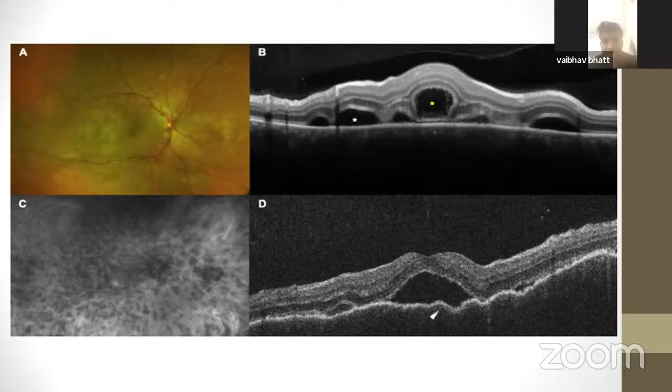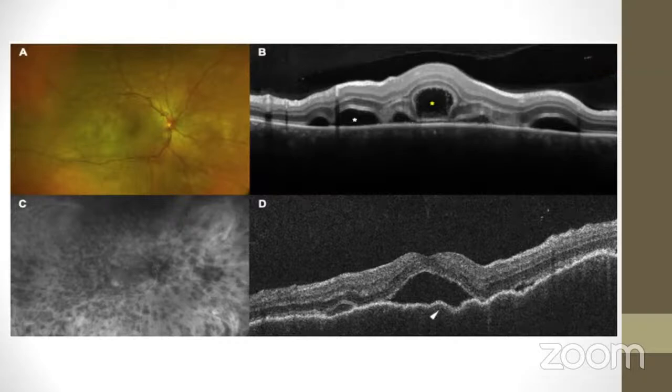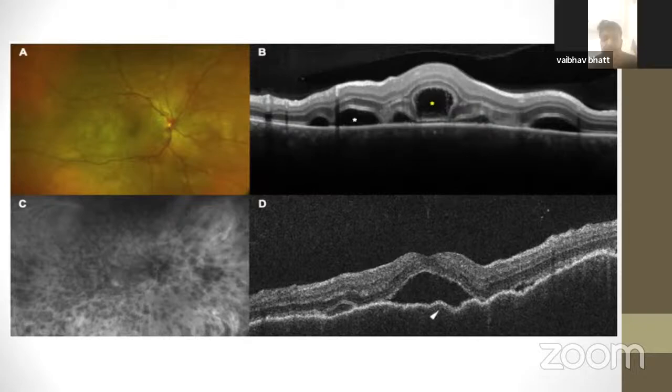Basically, they say that there's a membrane developing just over the RPE. Yes, sir. So why is there a difference? Why is the submembranous space totally echolucent, whereas in the yellow area, the supramembranous space, there is some debris, some signal? How do they explain the difference in content? So in the supramembranous space, the RPE debris are there.